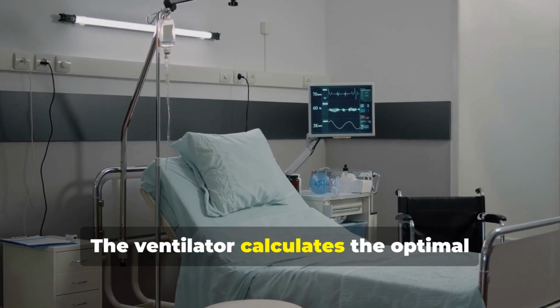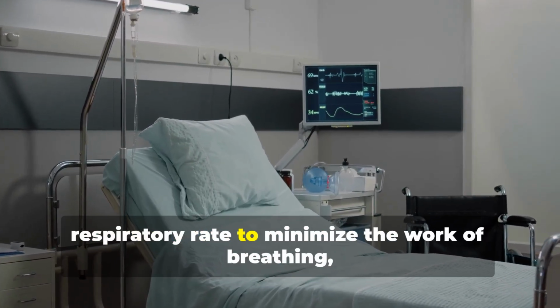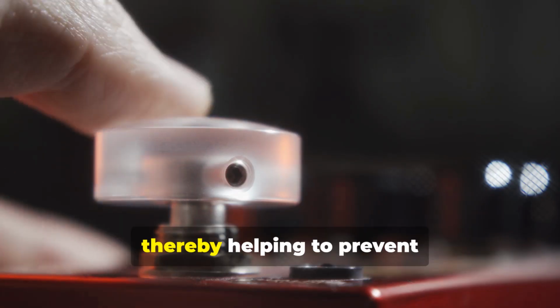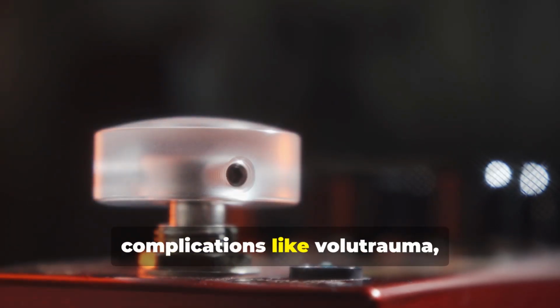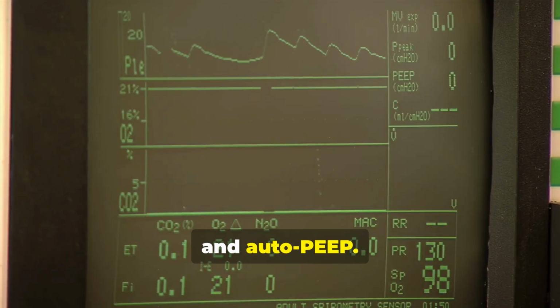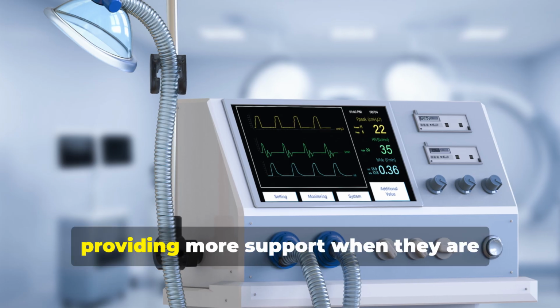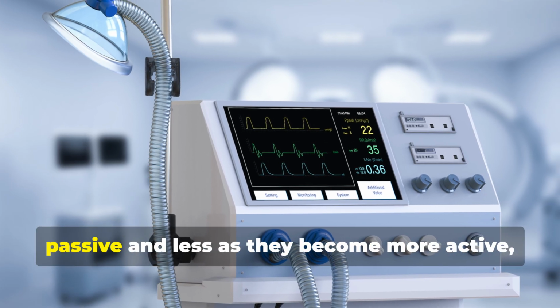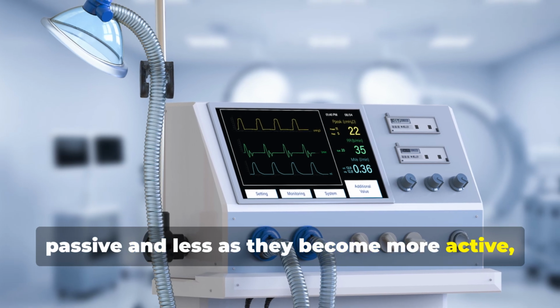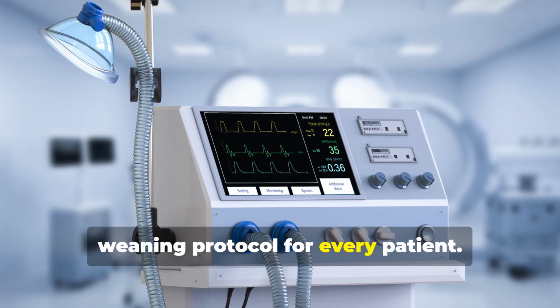The ventilator calculates the optimal combination of tidal volume and respiratory rate to minimize the work of breathing, thereby helping to prevent complications like volotrauma, barotrauma, and auto-PEEP. It intelligently adapts to the patient's activity, providing more support when they are passive and less as they become more active, effectively creating a personalized weaning protocol for every patient.